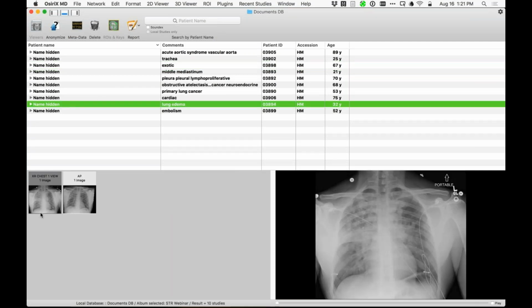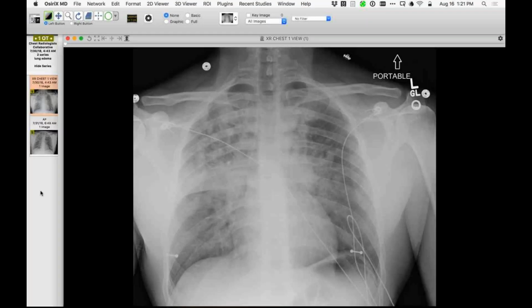All right. The bone formation in amyloid does it. I mean, it's well corticated bone. It's big pieces like that. It really looks as if it thinks it's some other organ.